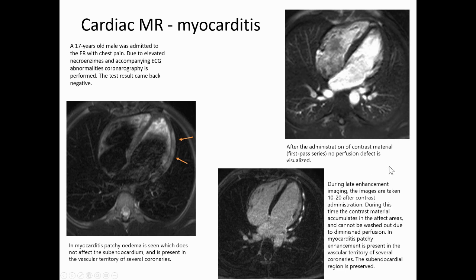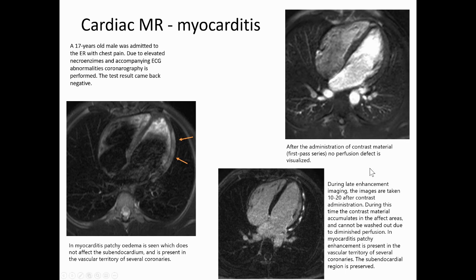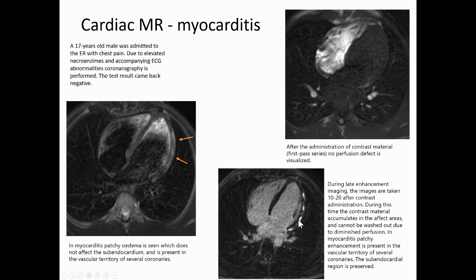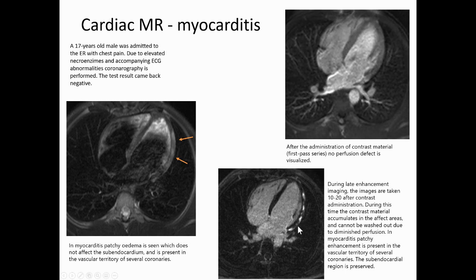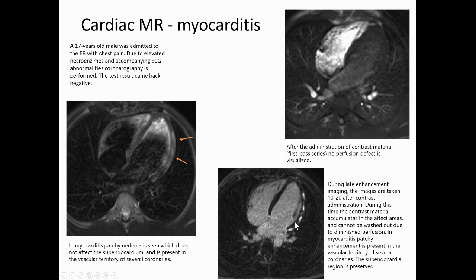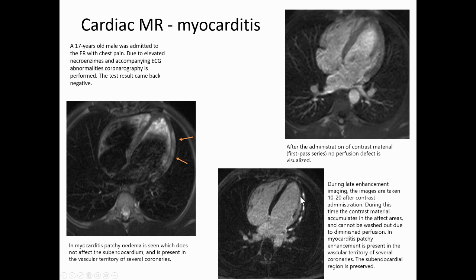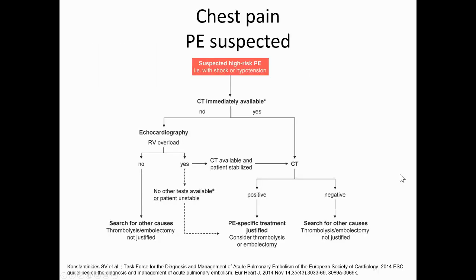Now, if we perform late enhancement, so we give contrast, we wait 15 minutes, and then we image the patient, you can see that some of this myocardium is affected. However, this patchy type of enhancement, which again doesn't affect the subendocardium, is diagnostic for myocarditis.